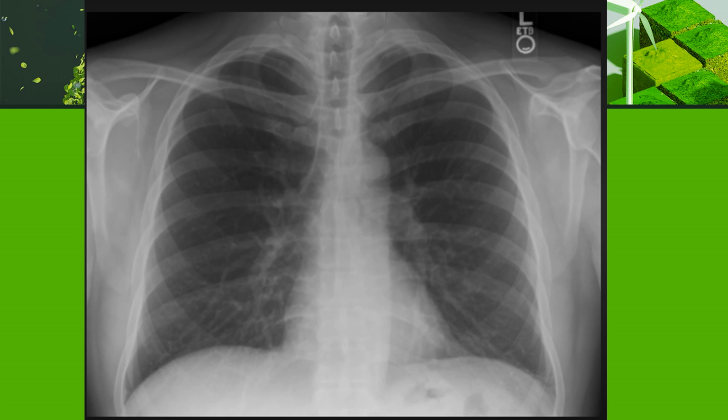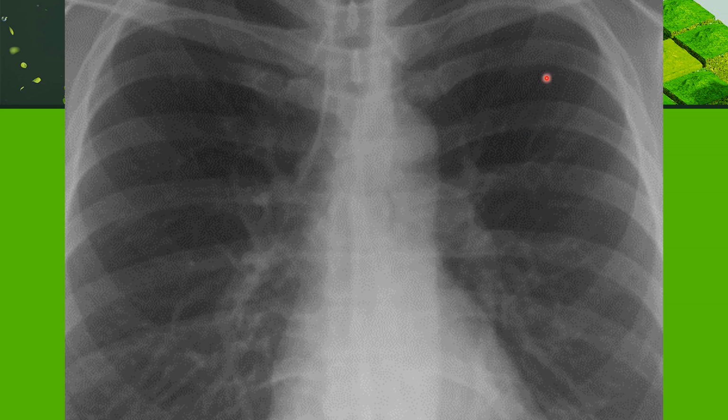Here you can see more closely that the lower lobe vessels look more congested in comparison to the upper zones, and you cannot easily track their borders. There are multiple vessels, you cannot track their borders. But in the upper lobe, there are very few delicate small vessels, and you can track their borders easily. So these are normally placed in comparison to the lower zones.